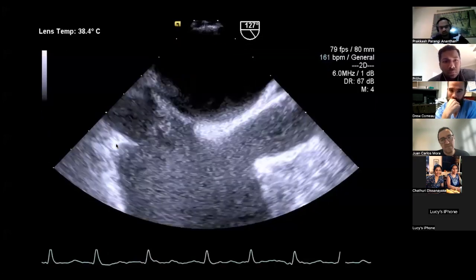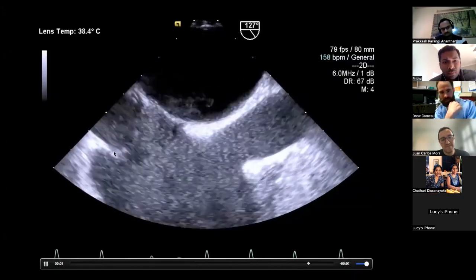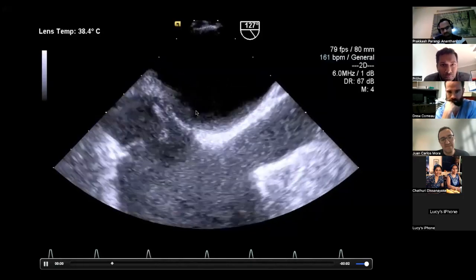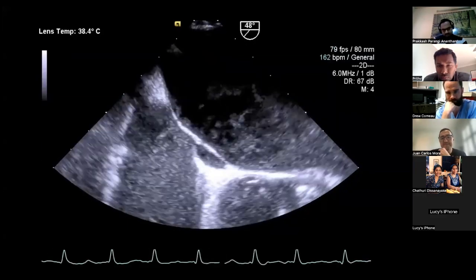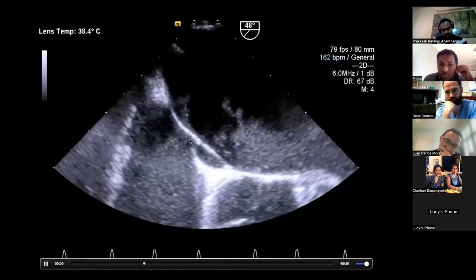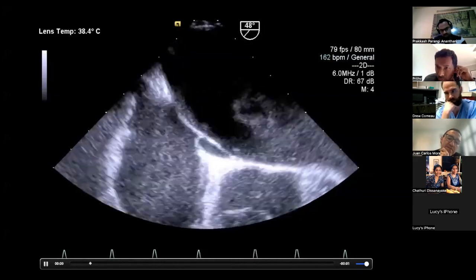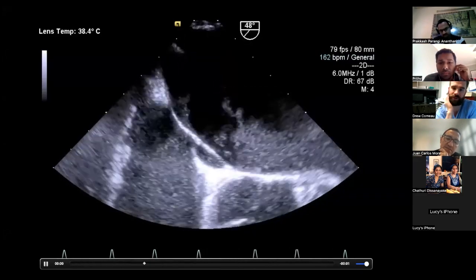What's that structure there? Oh, sorry, I don't know, is it the eustachian valve? Very nice. Eustachian valve, eustachian ridge, and so that would direct it directly towards that foramen ovale that you can see quite nicely there. So it would go against that, and then you might see those bubbles a little bit easier. So they talk about using the legs would help maybe pick that up rather than compression pressing on their tummy.